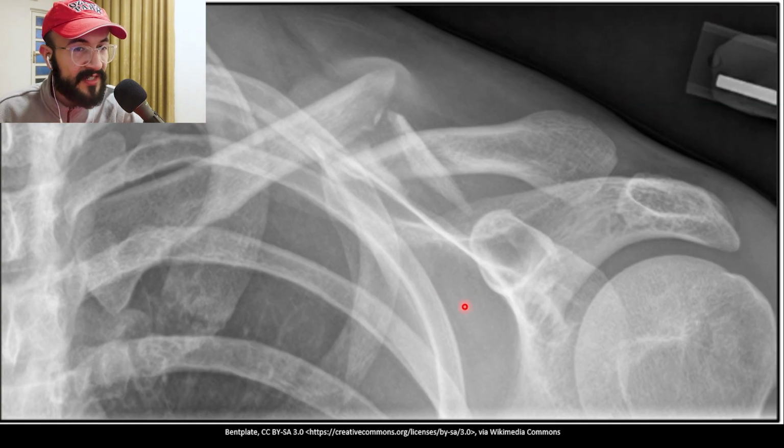On this picture here, we have an x-ray of an AP clavicle, and then we apply our steps. Starting with step 1, which is assessment of the bones, we assess the humerus, looking for any fractures. Then we assess the clavicle. As we can see here, we have a clavicle middle third fracture. It's a comminuted fracture that we can see here.